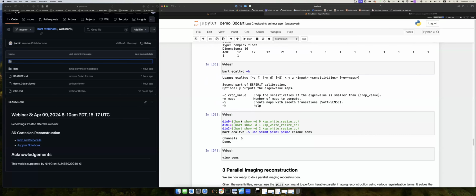But the question was, you need to do it like you write it, with first NUFFT and then FFT. There's no simple regridding. But I'm also not sure how you would do that. Do you want to just do gridding and then what would you do with your roll-off correction? Just basically trying to, for faster recon, just get to Cartesian quicker without having to go to image space first.